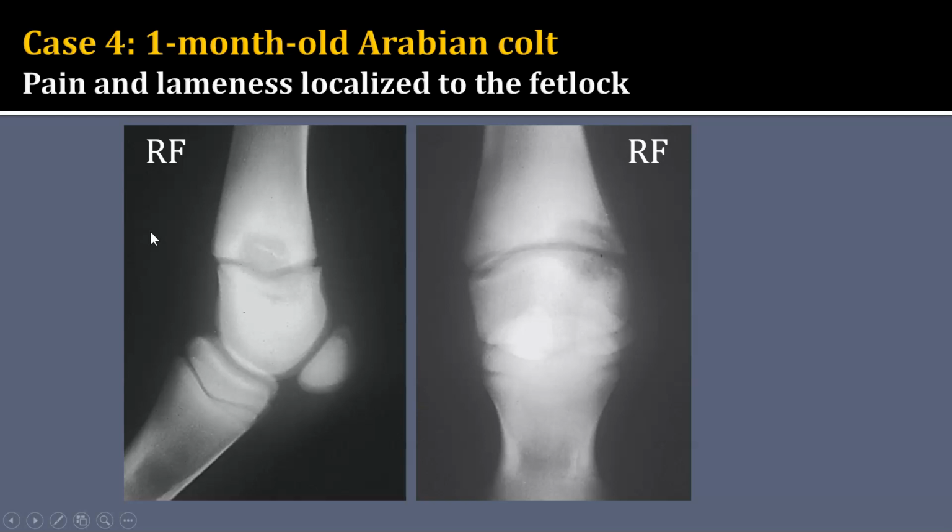And in this case, it was hematogenous spread, and it was spread to the physis where that rich capillary bed is. Now, I want to make a distinction between this being an infection and the physeal dysplasia we learned about. Remember, the physeal dysplasia did cause some widening and irregularity to the physis, but it did not cause lysis in the surrounding bone. So the lysis in the metaphysis and the epiphysis should lead us away from physeal dysplasia.